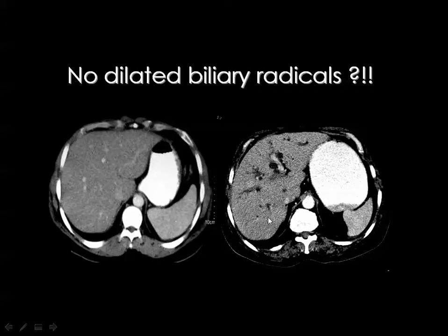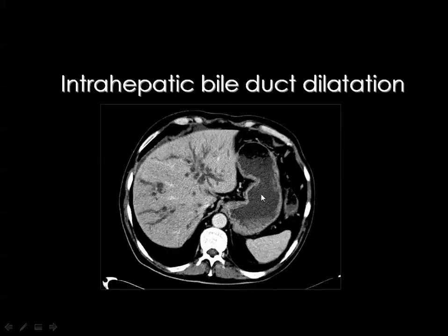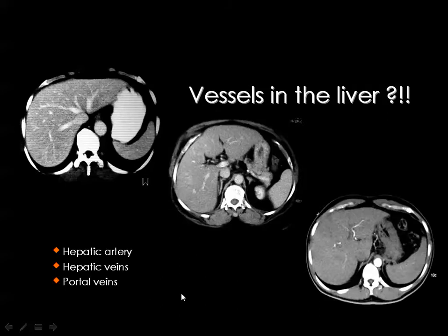of biliary obstruction. Then you should go further, and I will discuss this in detail in the lecture of biliary imaging, looking for the site of obstruction and the cause of obstruction. But the initial diagnosis should be biliary obstruction whenever you can see multiple linear hypodense shadows going throughout the liver parenchyma.